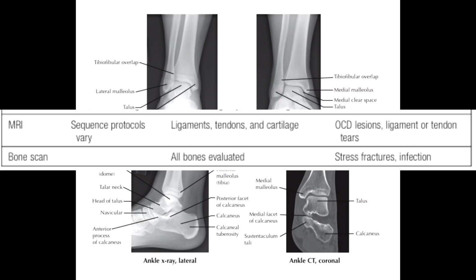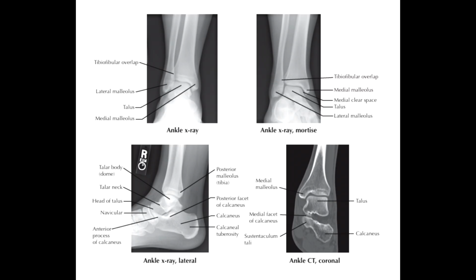Now, let us revisit the clinical correlations in greater depth. In the AP view, we look for malalignment, fractures, and arthritis. Malalignment may indicate malunion of previous fractures or congenital deformities. In the mortise view, any asymmetry in the joint space suggests instability. Widening of the syndesmosis indicates high ankle sprains, which require different management than typical low ankle sprains.